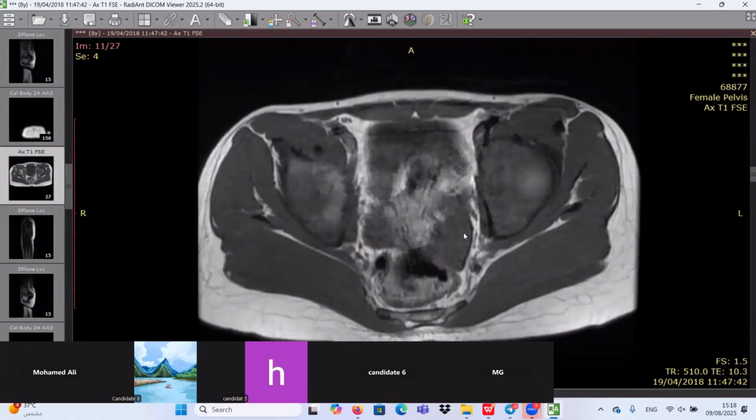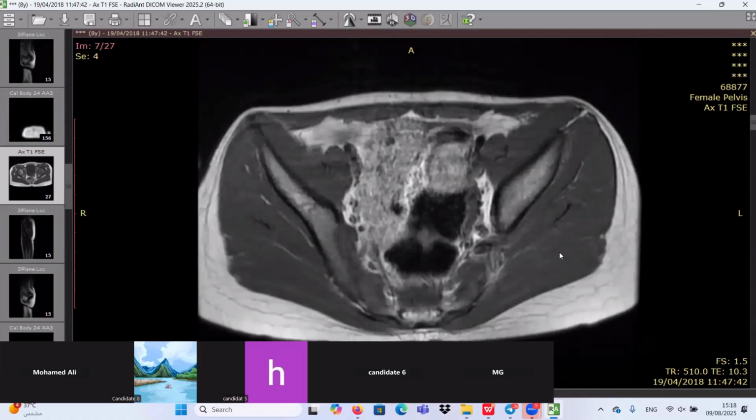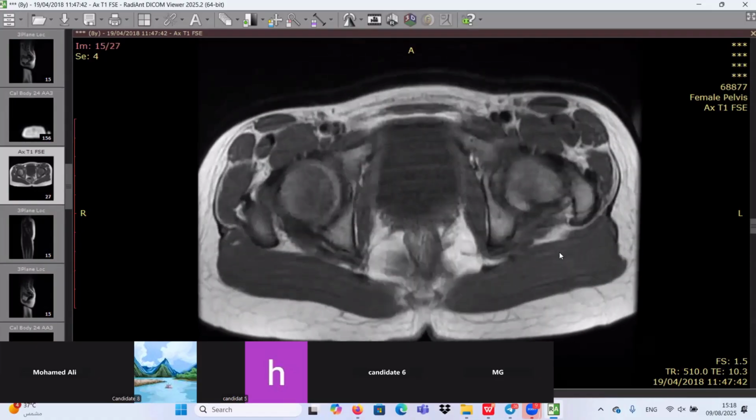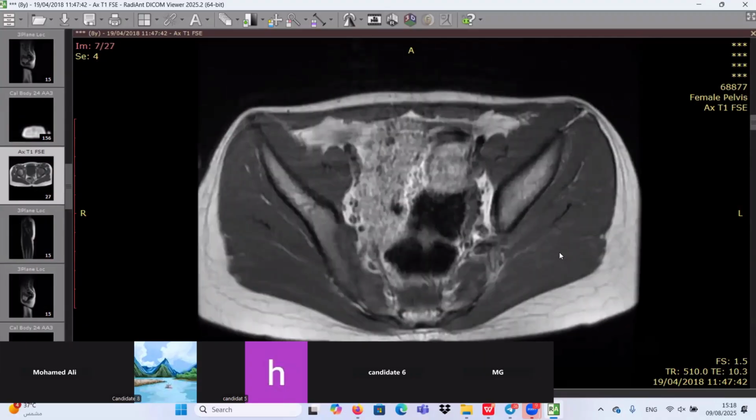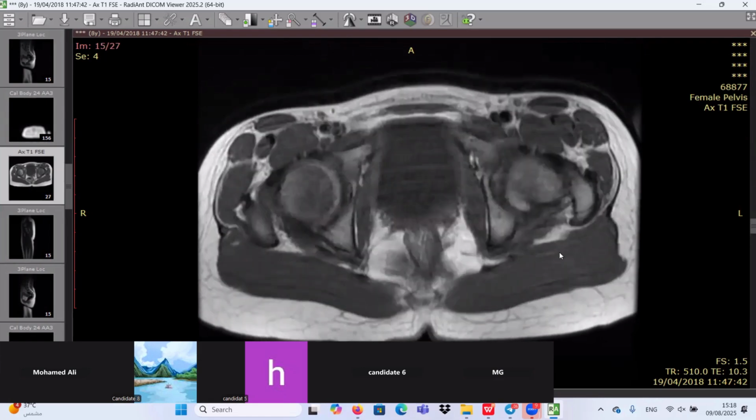These are the T1 weighted images, and there is no active focus of hemorrhage, but a few hyperintensities are seen within it, but no active focus of bleed. I would like to see the post-contrast T1 fat-sat images as well to see any adjacent or inside abscess. Do you want to inject contrast?